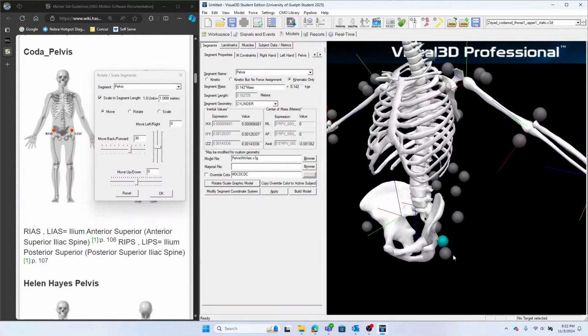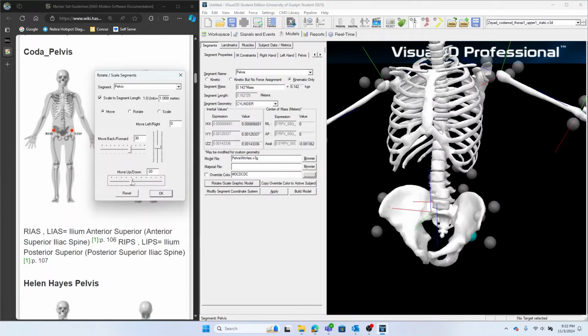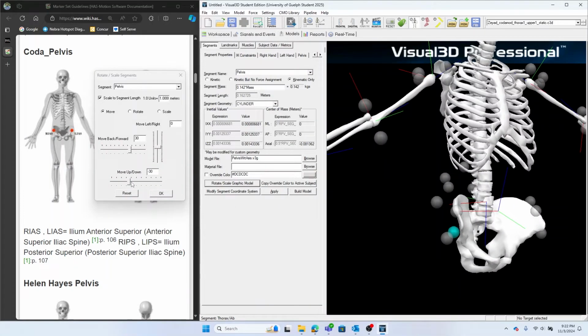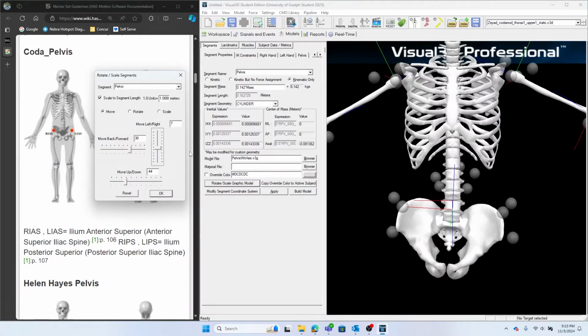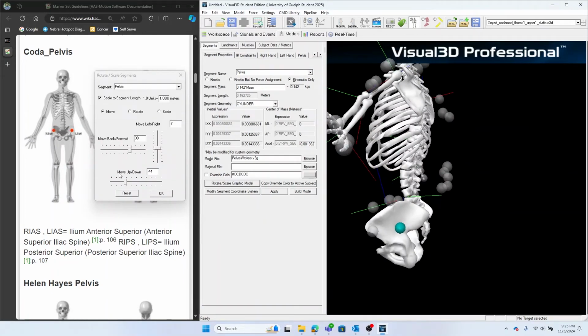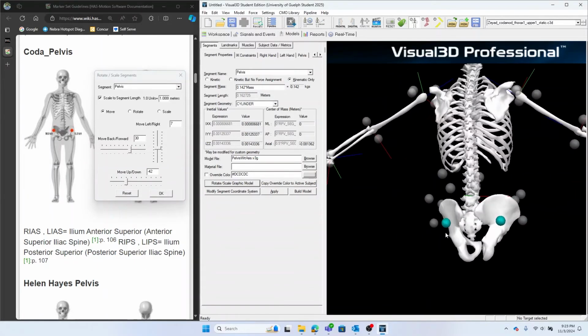Though, if you notice, we are quite high. So what I can do is use this slider, slide it down a little bit. You see this? Slide it down a little bit more. A tiny bit more. This is too much. Okay, this is good. And then maybe left and right a little bit. Okay. What do you think? There's a gap here. So maybe I should move it a little bit more up. If you want to do it finely, you can control it manually like this. Okay, the gap is gone.